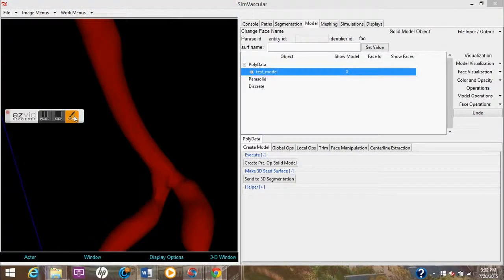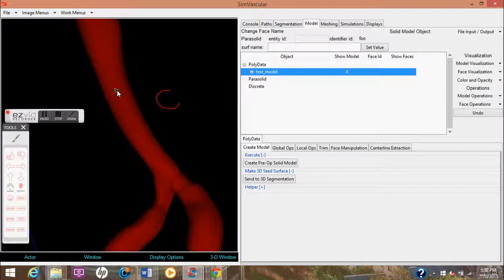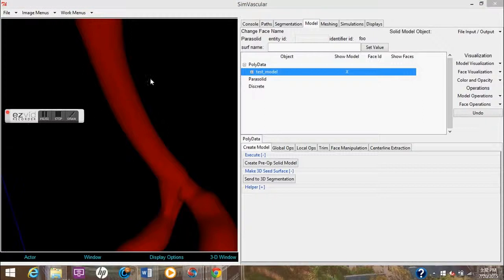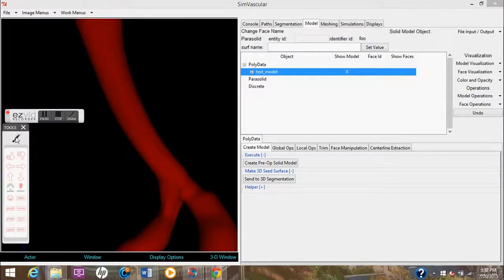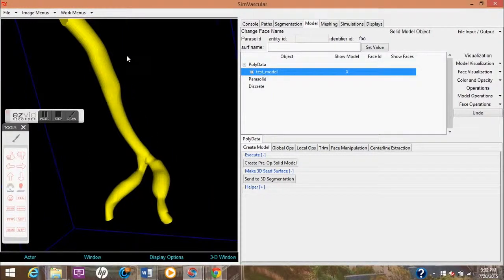And then if you press C, I believe it is, yep, C, you're going to be able to pick the cells individually. So with C, you just hover your cursor over it, you hit C, and then you get the individual cells themselves. And then P is to pick the model and make it easier to visualize. So you hover over it, you press P, and it becomes this fluorescent yellow.